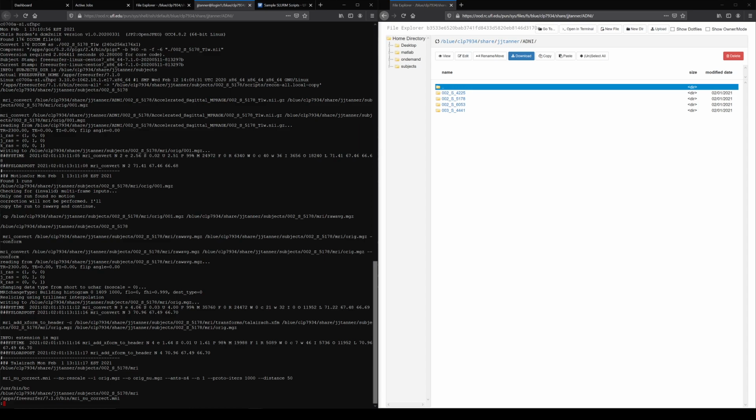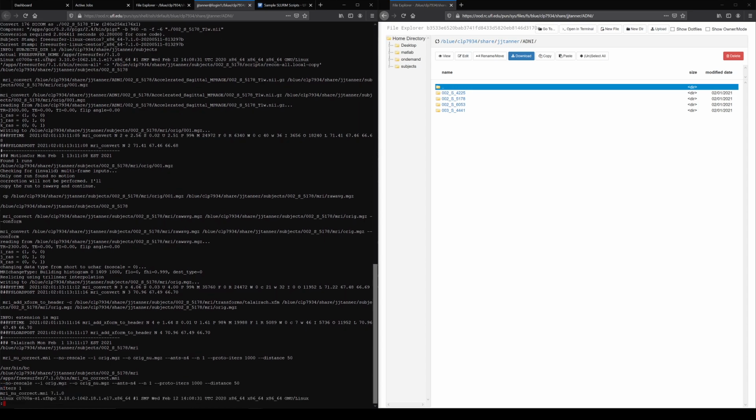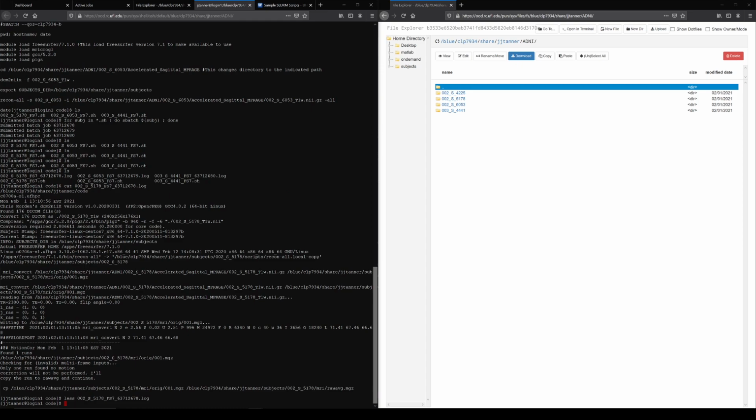And so then I could read through it and go, so we're starting at the top, DICOM to NIfTI, found files, converted, and then now FreeSurfer is running. There's a subjects directory, and you can go through there. There's a lot of text in here, but it is processing it, and it didn't give any errors right away. To get out of this, I can hit Q to quit out of that.